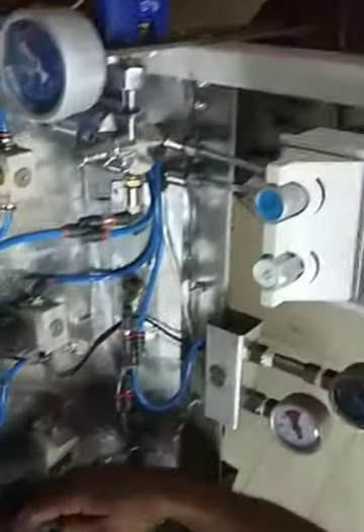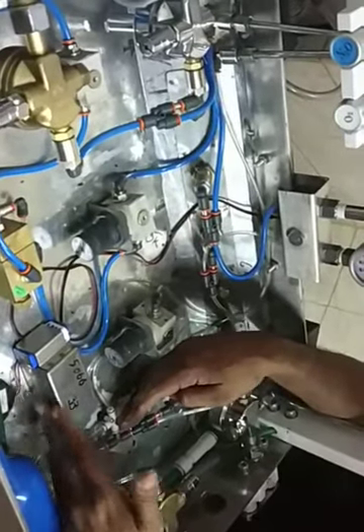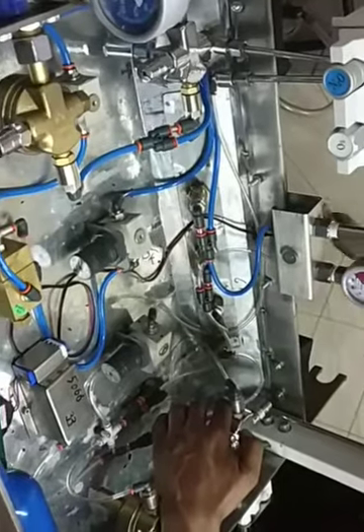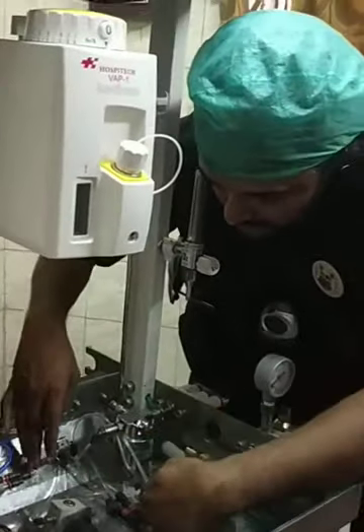Now if you see, the oxygen is coming from here, it's coming here, like this is where it is getting connected, okay, and this goes to the hypoxic alarm, which helps us to know whether the flow of oxygen is adequate, the pressure is adequate, whether it's coming or not. Then from here, this is going to the ventilator, if we have to connect to the ventilator, okay, and then again the inspiratory and expiratory. So can you see how interconnected these are?